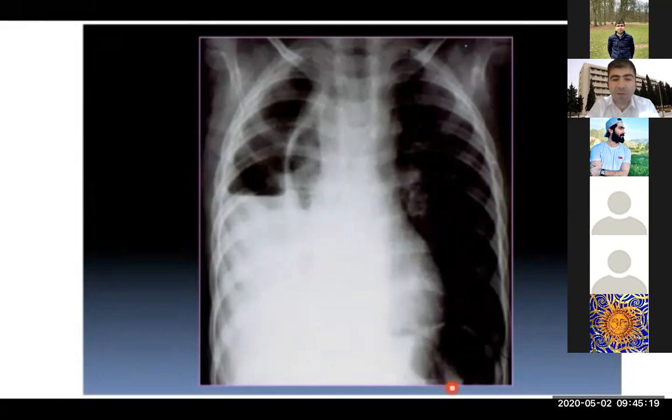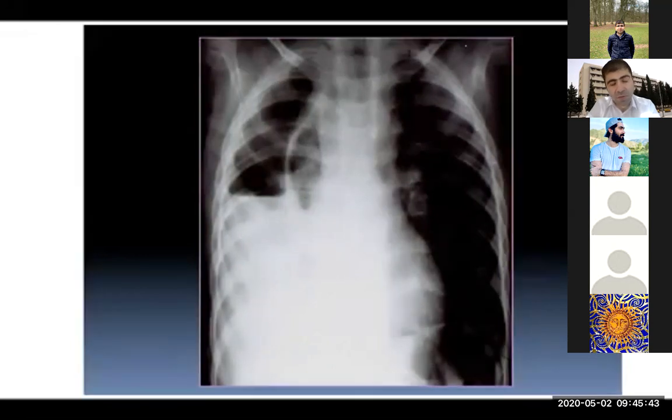So this is partly because it has been cut actually. Yes. And here you cannot differentiate, right? Yes. Okay. So what's about E? If any effusions, there's no any effusion. Effusion in the pleural cavity or any air in the pleural cavity. Okay.